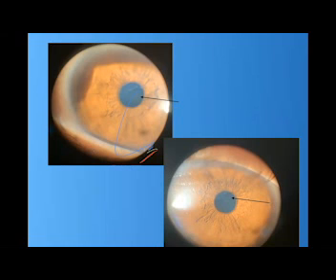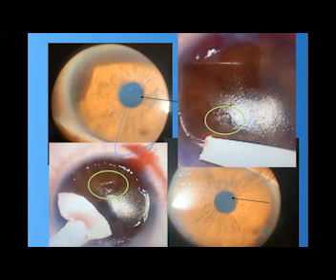So you can go for refractive surgery because all the irregularities are explained. The cornea is not thin, the cornea is not weak, but the corneal surface is irregular, and so we can go for refractive surgery. But I have done a flap.